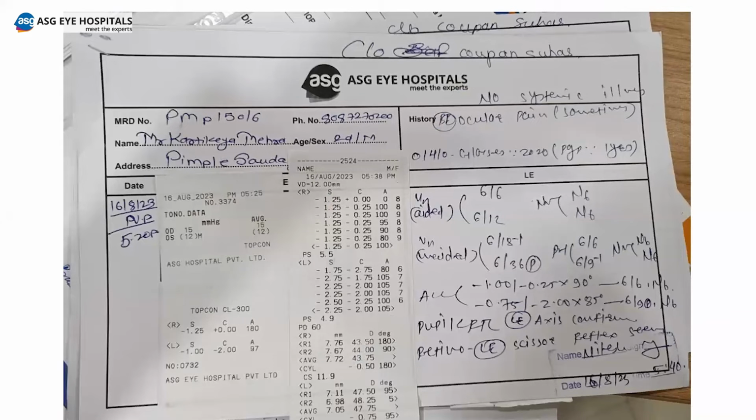Okay, this patient came to us. In the keratometry, can you see any difference in the AR? Yes, ma'am. The left side keratometries are steeper. So this was a 29-year-old male who had got glasses only for the last 3 years, and he had mild ocular pain and this kind of keratometric difference. What we are always seeing is scissoring. I have a habit of doing retinoscopy in all patients that I feel might have keratoconus, and it is extremely rewarding because that is one thing you can do even if you don't have anything else.